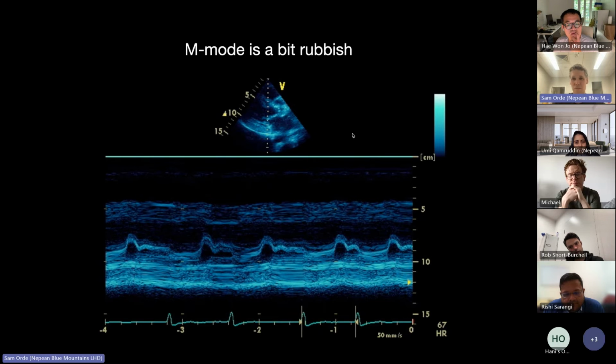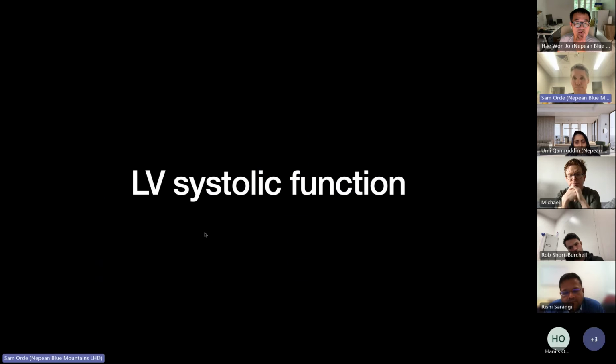Does it still tell you some information? Yeah, maybe. I think we can still see there's not a lot of movement of that ventricle wall. We still can see that there's maybe not that much of an E-point separation. At the end of the day, I think we've got better ways of assessing some of that, right? So generally, we don't see these images much in modern day echocardiography through the LV. All right, so that's LV size.